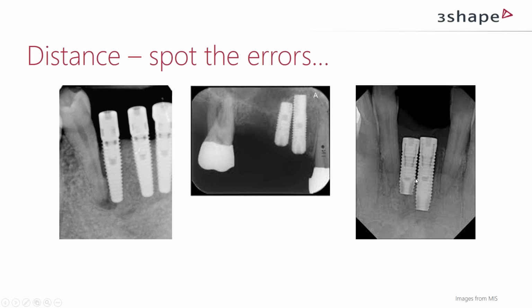So if there is no bone in between, we don't reach our first main goal, to have bone surrounding the full implant. So this is most certainly a failure. Interesting that the human body almost knows that the goal is 2 millimeters in all directions, and if not succeeded by the surgeon, then this is what will happen.